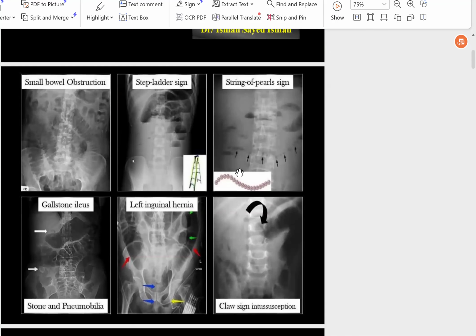But if it is a classic small bowel dilatation, after describing the dilated bowel loops, the mucosal folds and the distribution, what are you looking for? Possible causes, like what? Surgical clips, number one. Number two, any radiopaque shadow or branching lucency overlying the liver, which may represent pneumobilia if centrally located, or if peripherally located and extensive, maybe portal venous gas. Also check for any coiled spring sign, as in case of intussusception.